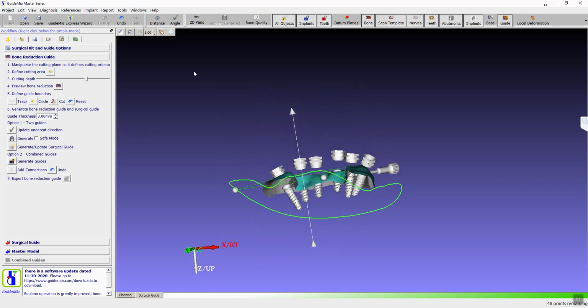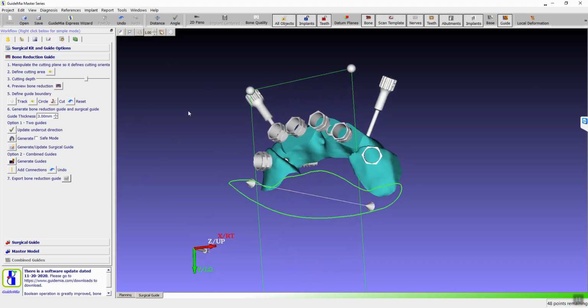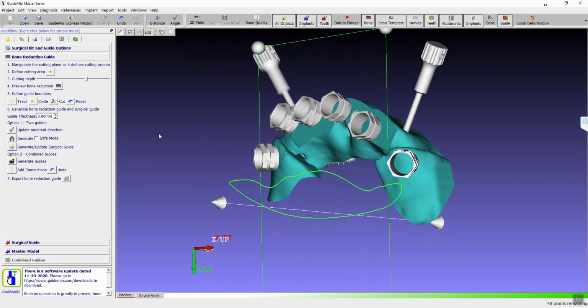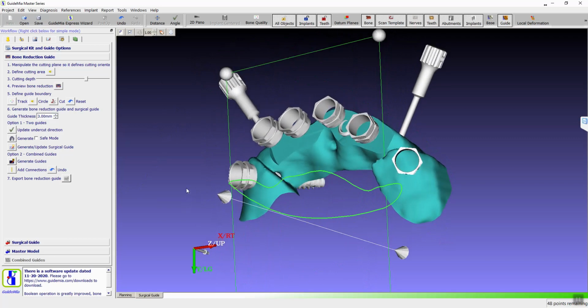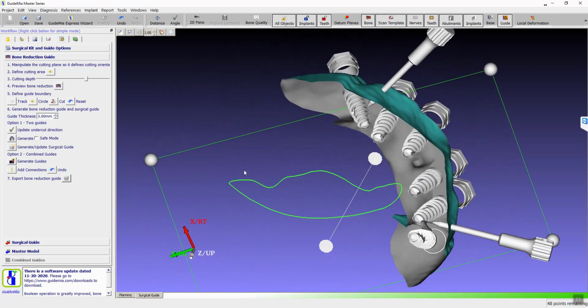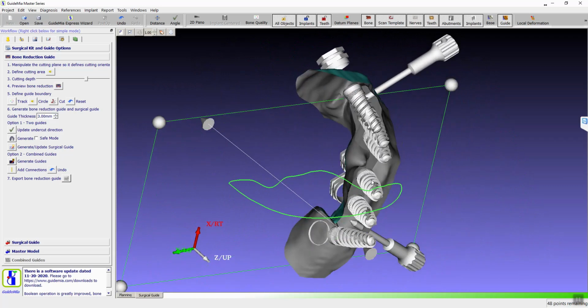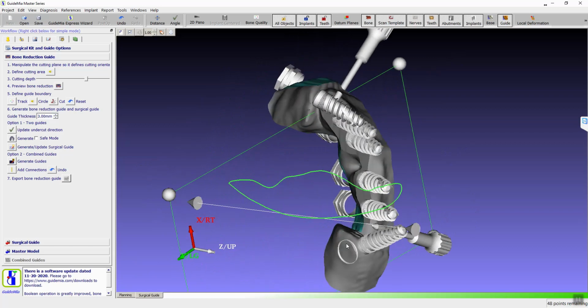So that's the base for the surgical guide we have here. There's a little bit thing here. I think I cut this way too much. I remember the second cut for the tissue model, I probably cut too much. So there is a sharp thing here.